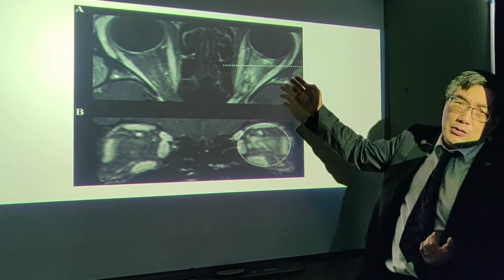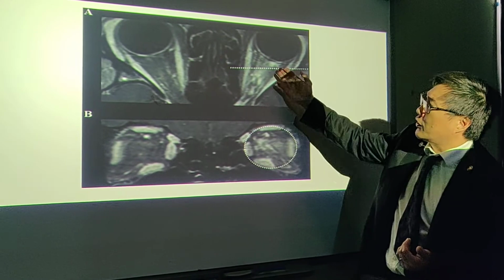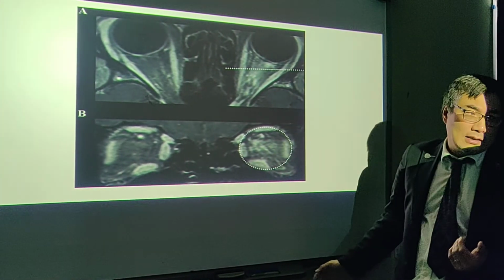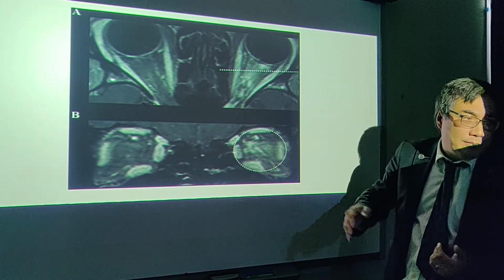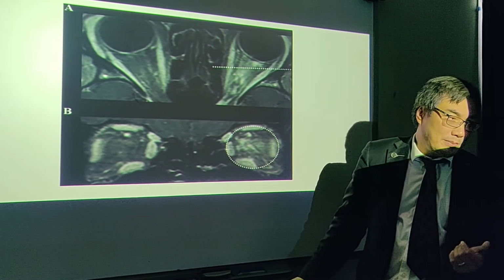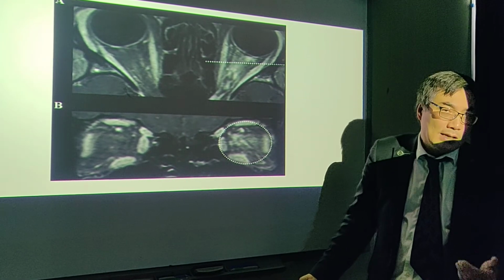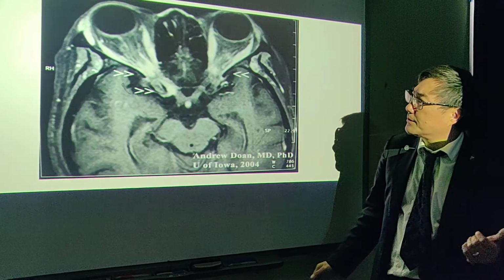And finally, we want to know about MOG. So MOG, the sheath and also the fat, so it goes outside of the optic nerve, the MOG, myelin oligodendrocyte glycoprotein. The MOG doesn't enhance just in the nerve, but also in the sheath and the surrounding tissue. So when we see these atypical imaging patterns, you should really be thinking about NMO, MOG, sarcoidosis, and the usual inflammatory and infectious mimics of optic neuritis.